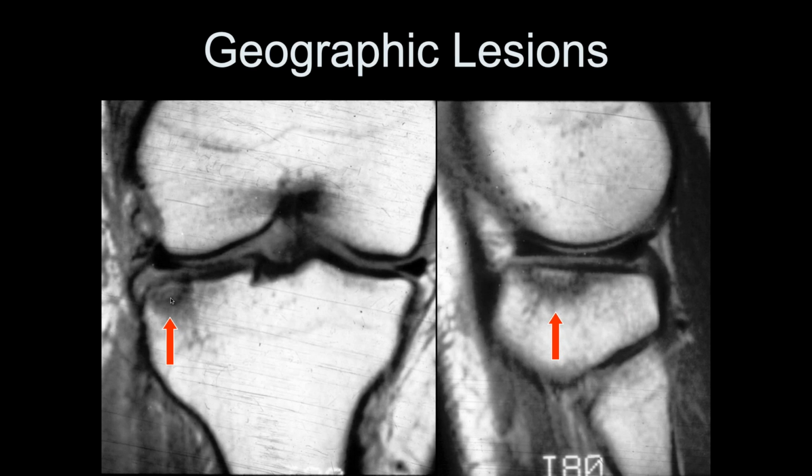On follow-up arthroscopies, I don't think you'd be able to really see that with the scope without doing some damage to the articular surface. The meniscus is right on top of that area. You'd have to go underneath it, and that's a tight area right there.